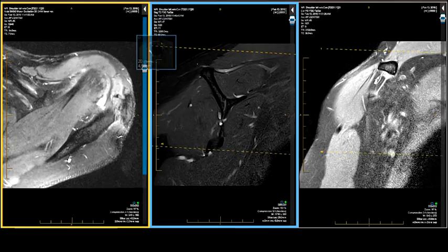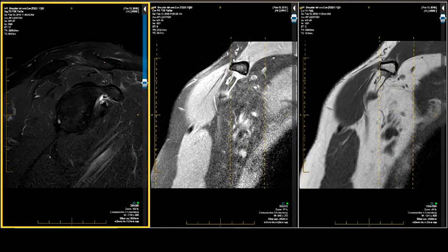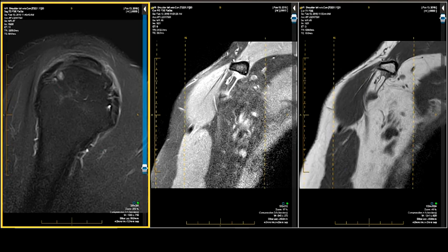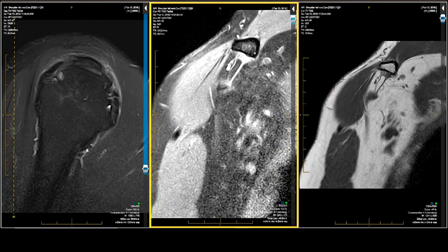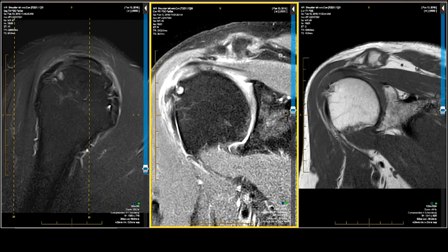Let's put up the rest. I've got a sagittal and two coronals. Now, I like to have a coronal PD, and I do, a coronal T1 and a sagittal T2 with fat suppression, so I get a slightly different contrast character. And why is that? Well, because the T2, when you have a massive injury, tremendous swelling and edema and blood, and you can't see anything on the PD, the T2 often cleans it up. In other words, most of the tissues sort of fade down in signal, and you can see the edges of ligaments and tendons. So it's kind of a cleanup sequence.